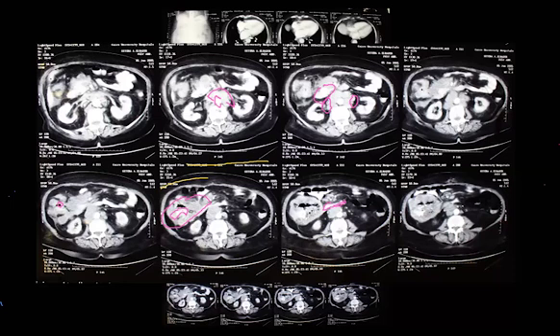What is the image that we've seen and what have we diagnosed? This is a CT abdomen, axial cut, contrast enhanced (oral/IV), abdominal axial CT. Yes, and what does it show? It shows multiple hypodense lesions surrounding the aorta. Yes. Most probably lymph nodes.